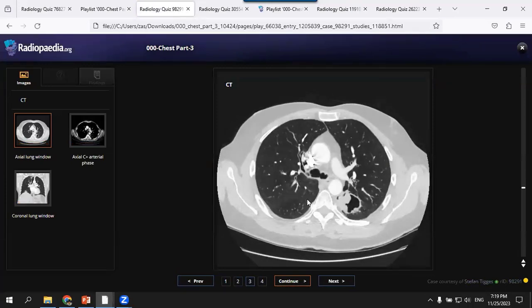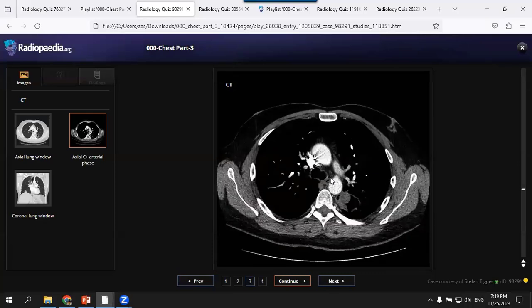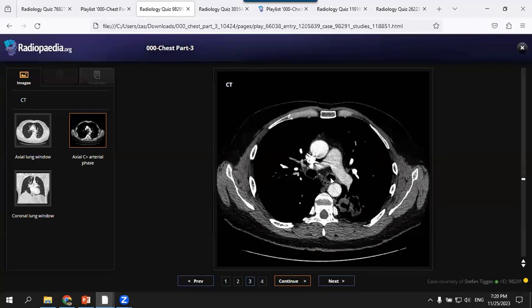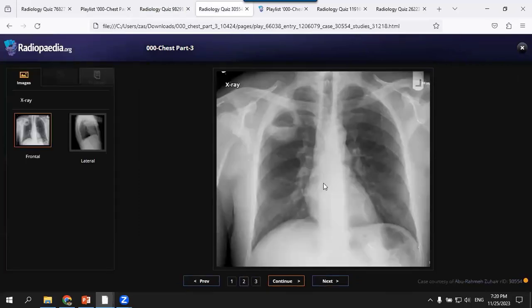This is a lung window of the same patient demonstrating a cavitating mass in the left upper lung with a thick nodular wall, with consolidation. Most likely the same etiology, or the same differential. If the patient has another CT or, for example, sinusitis, I think it's a case of Wegener's. But from X-ray, just a differential. This is an easy case.